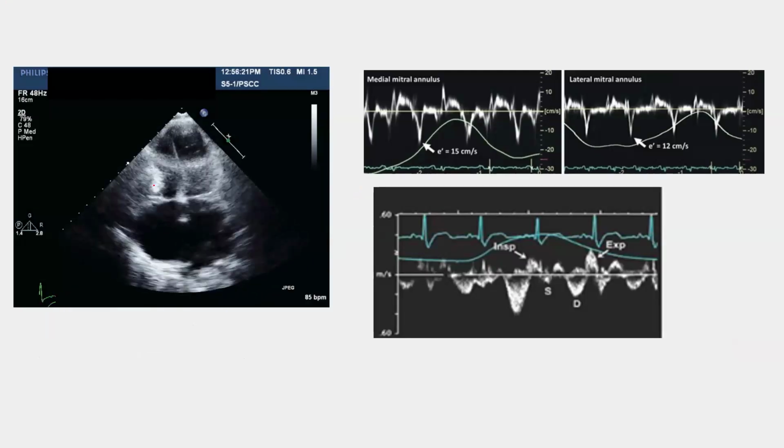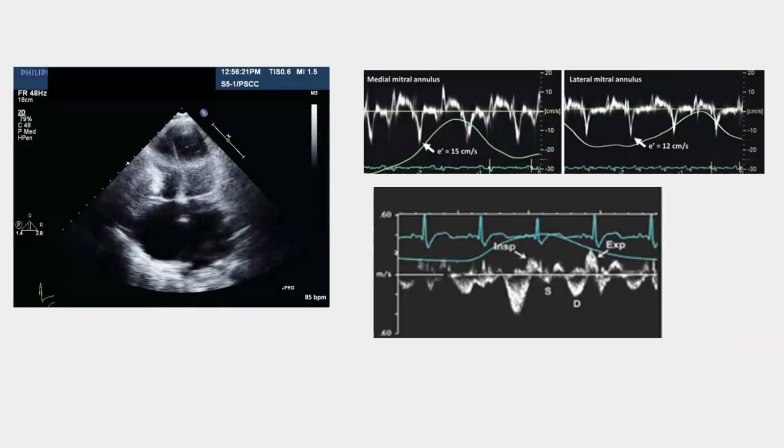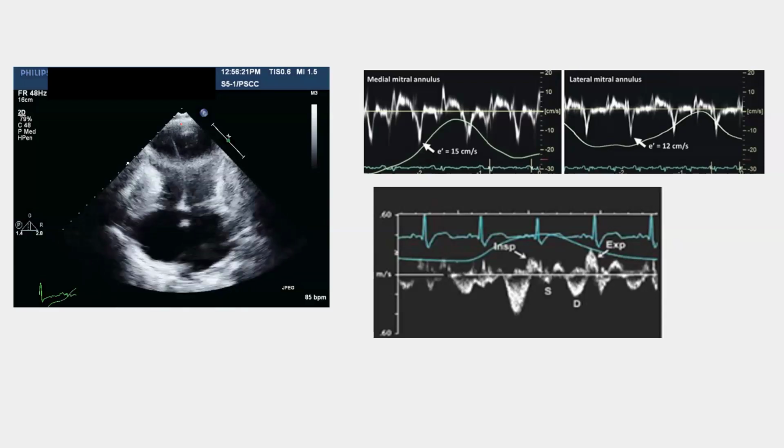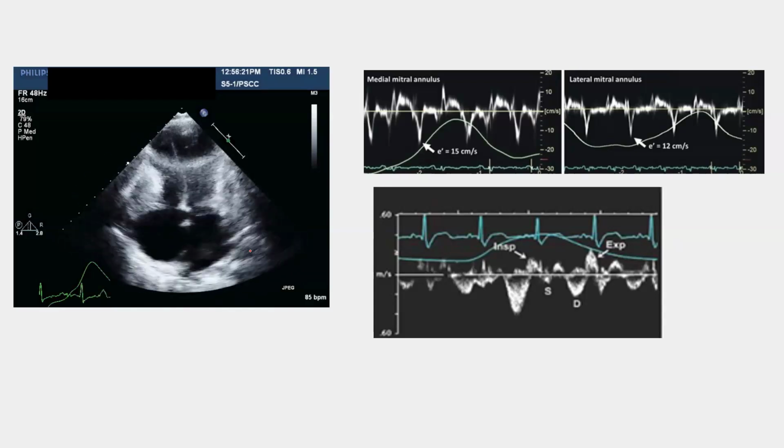They are constricted from outside, and they become kind of wasted here. Yes, there is chamber distortion. This is an extreme degree of constriction. So this is what you see morphologically. Most important is the septal bounce.